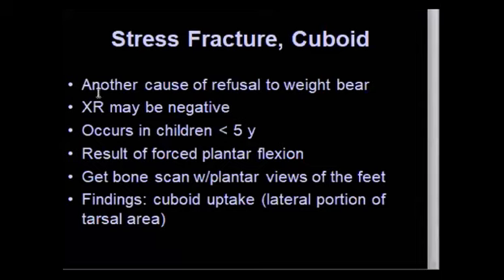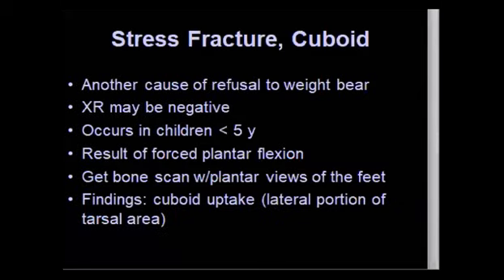Sometimes the X-ray in this patient can be negative, which is why you need the bone scan. It results from forced plantar flexion. You will find tarsal uptake in the cuboid, as you see.